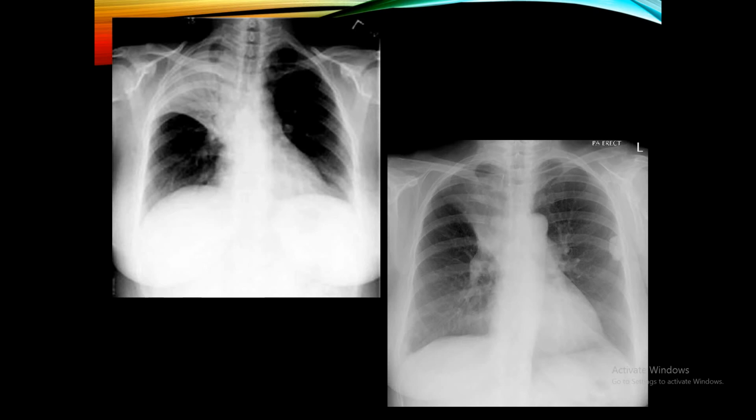In this chest X-ray, to the left we have patchy opacifications with some air bronchogram. The patchy opacifications are limited inferiorly by a line. This line is concave upward, or elevated upward, and represents the horizontal fissure. Again the trachea and mediastinum are central, but the horizontal fissure is elevated. So we have one of the signs of loss of volume, and we are dealing with a right upper lobe patch due to collapse.